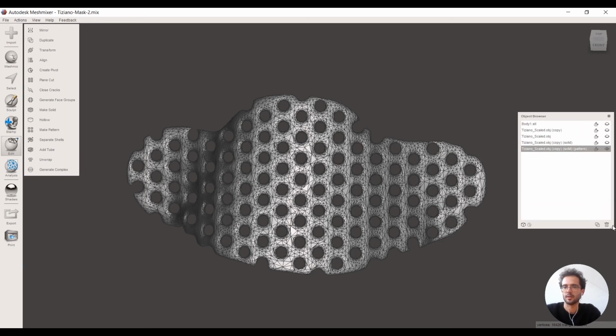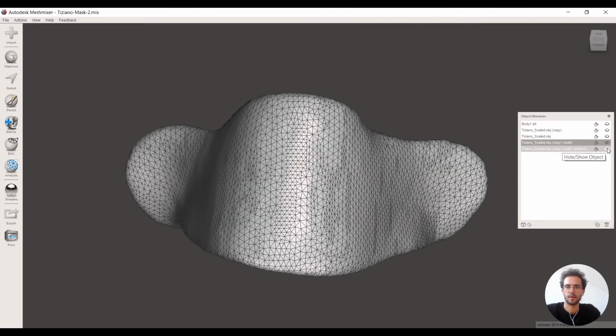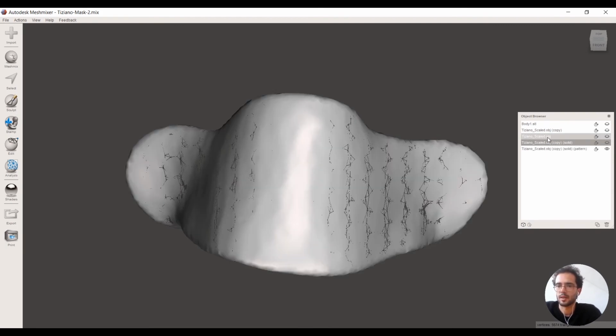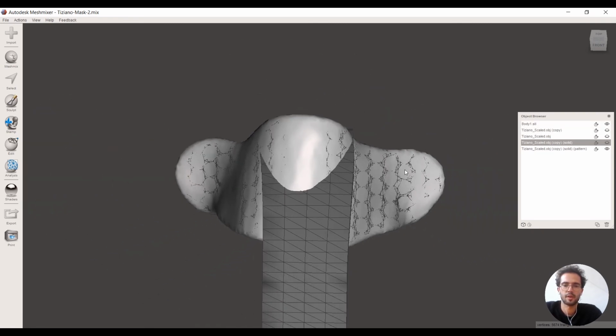The other file is still here, so I can still use the other file, but my new file is this one. In this case I prefer to show everything I need.